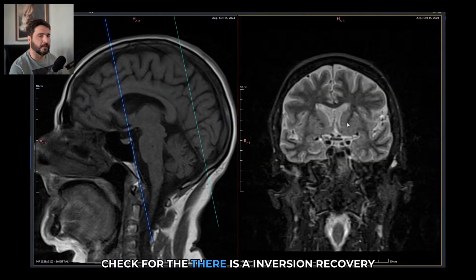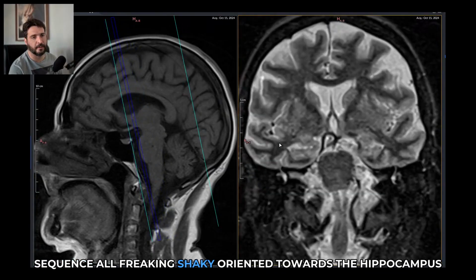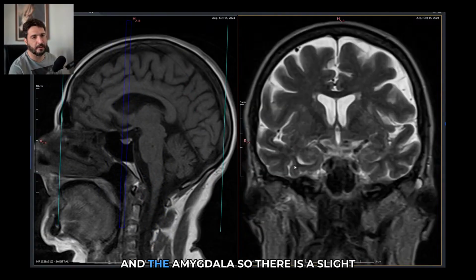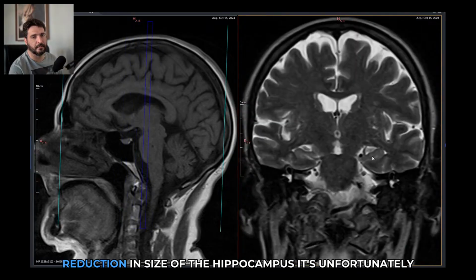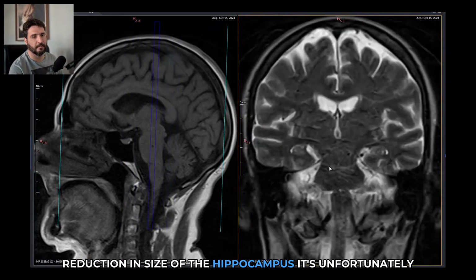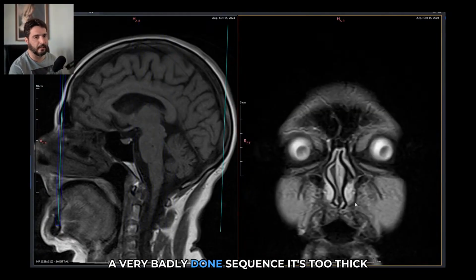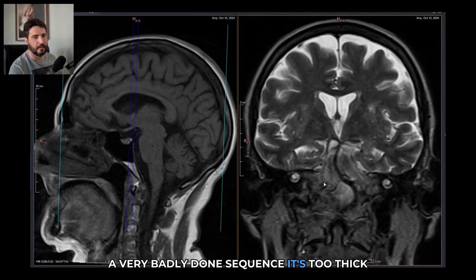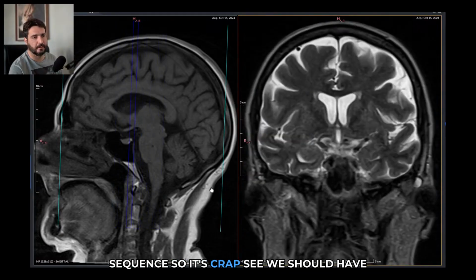Let's check, there is an inversion recovery sequence. Oh, freaking shaky. Oriented towards the hippocampus and the amygdala. So there is a slight reduction in size of the hippocampus. It's unfortunately a very badly done sequence. It's too thick. They made it as thick as any other sequence, so it's crap.